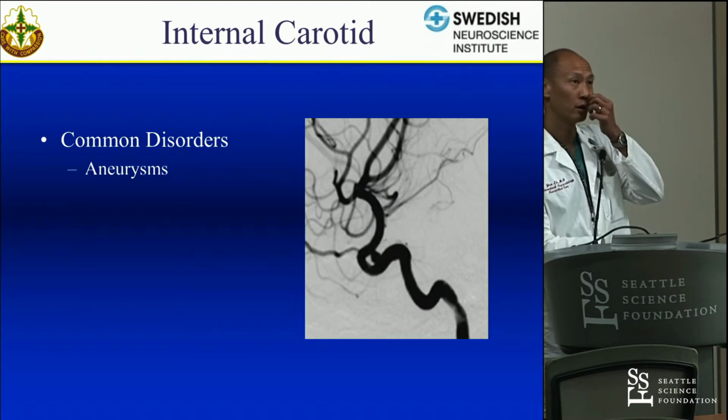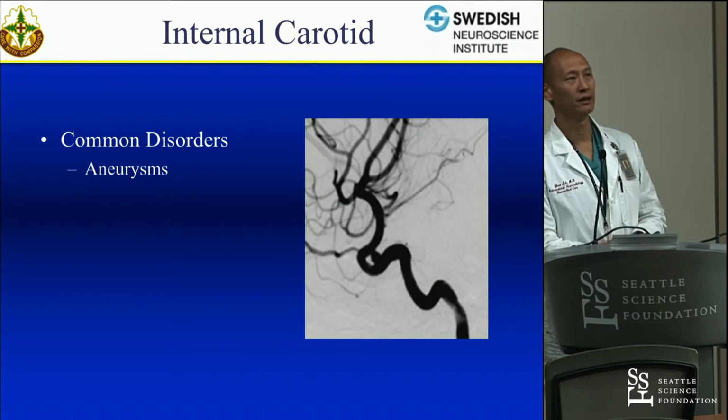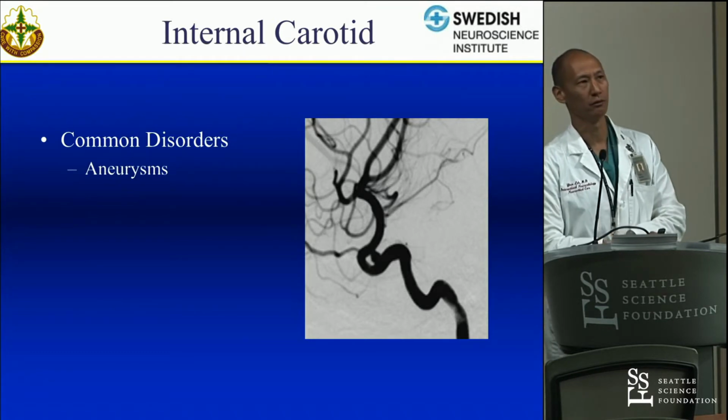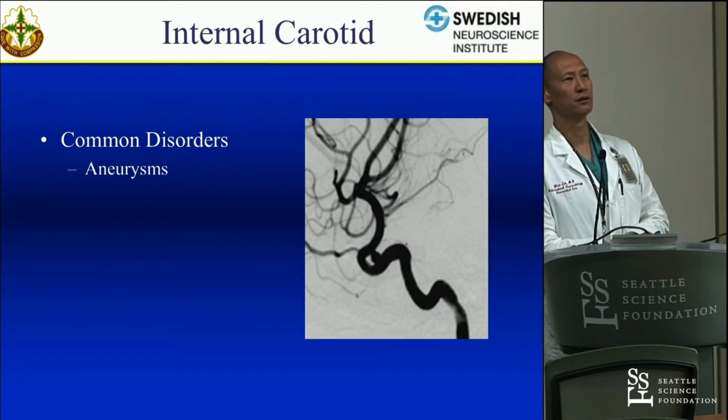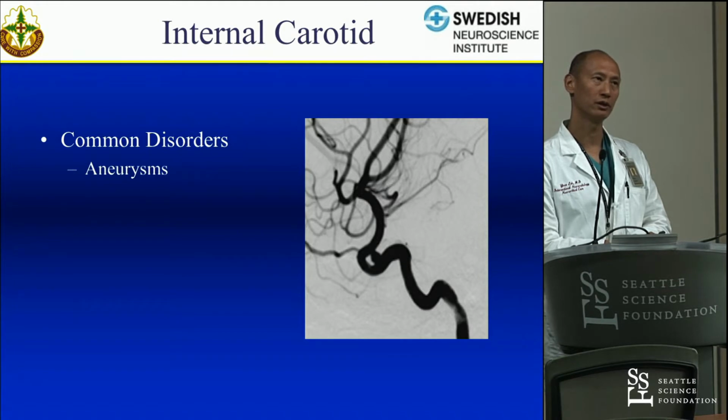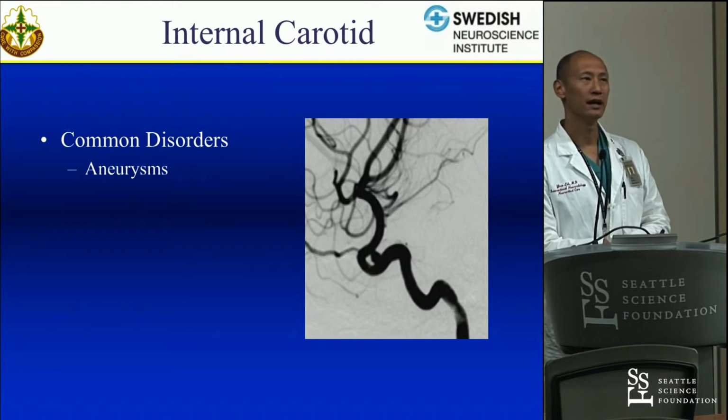Moving a little further, we talked a little bit about carotid cave, and that is a good debate. I was always taught, Fernando Vinuela said, that in the carotid cave, if there's a chance that it could actually be supraclinoidal or in the subarachnoid space, then it should be treated. And typically the relationship of the carotid cave is, as Shane mentioned, medial and at the level of the distal ring.